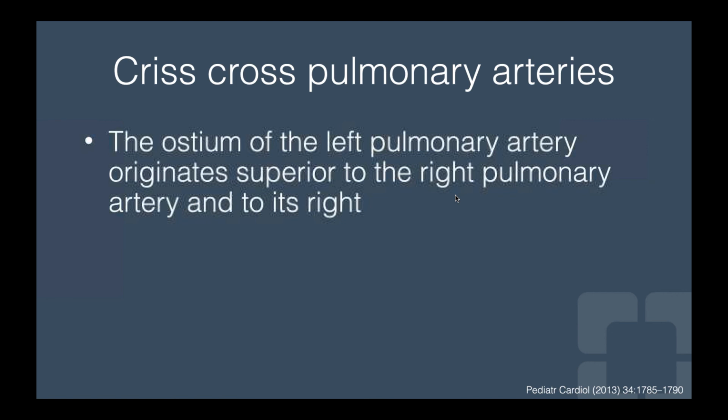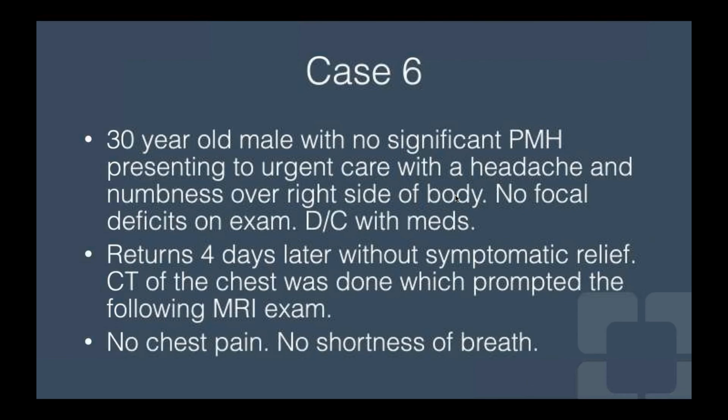Okay, let's do the same. We're going to have a loop going back and forth in coronal reconstruction. It's a bit slower. There you go. So it looks funny, but anything else that you can pinpoint? And if not, that's okay as well. I'll show you something else.